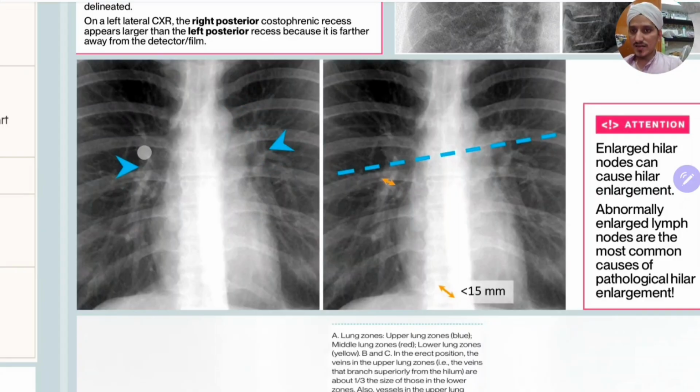So this is in an obtuse angle like this, okay. And if you draw a line like this, it will be like this in cross, okay. If you measure the distance from this to this, it will be less than 1.5 centimeters. How? First, you draw a line, this angle line, I will mark it like this. It is like this, and this is like this. You just draw a line like this. Now if you measure this distance, it will be less than 1.5 centimeters.